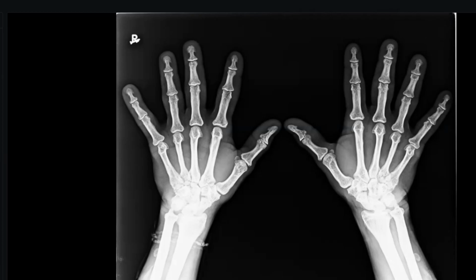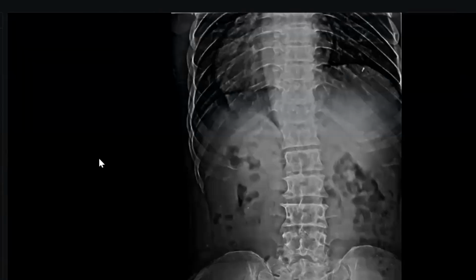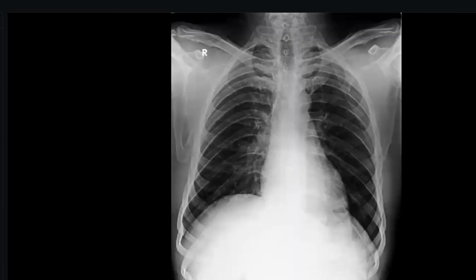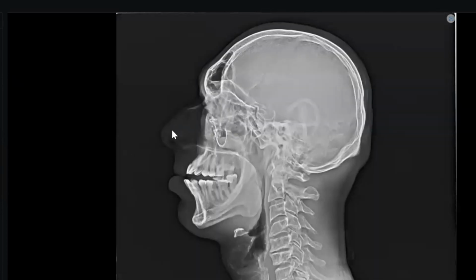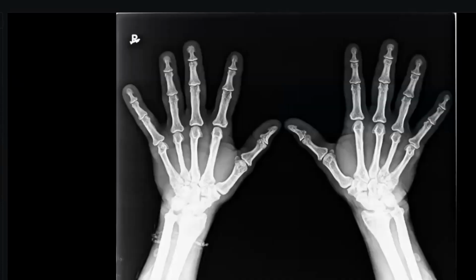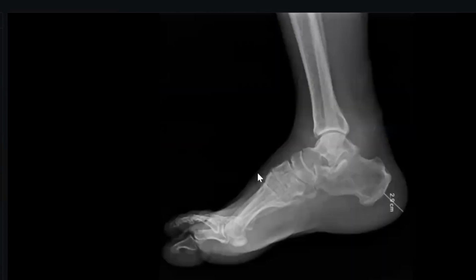I just explained to you two different cases of acromegaly. The examiner will start from the periphery, my colleague. Because if you didn't suspect acromegaly, he will not give you this at all. This is in the last. He may start from here or here. And you should tell, doctor, there is an increased fat pad of the heel. Thank you, my colleague.